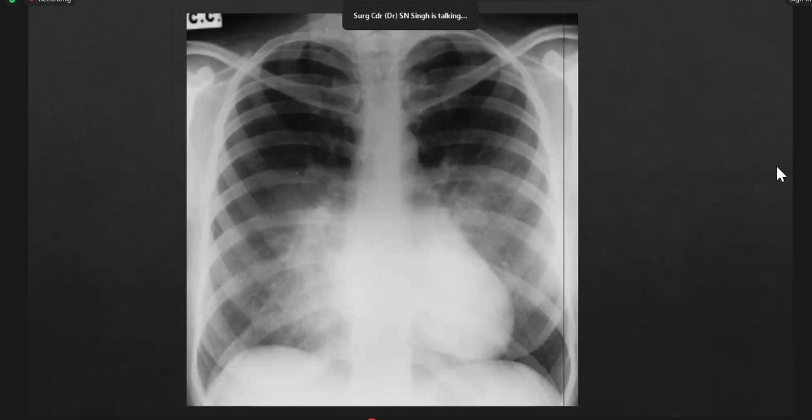Who is taking this? Who is taking this? So Swaksh, you have taken it. You start with the frontal chest X-ray, and then you keep speaking. Learn that art, because the examiner doesn't like you quiet for 15 or 30 seconds. It doesn't look good.